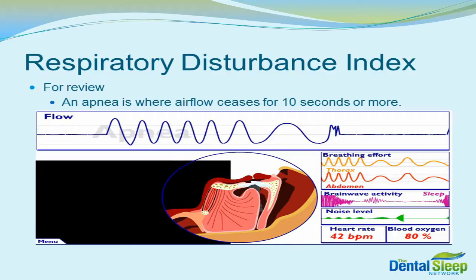Recall that an apnea is where airflow ceases for 10 seconds or more. In this picture, we see the apnea represented at the top portion of the picture of the airflow, where the line is a straight line. That's indicating that there is no airflow. If that's 10 seconds or more, that's considered to be an apnea.